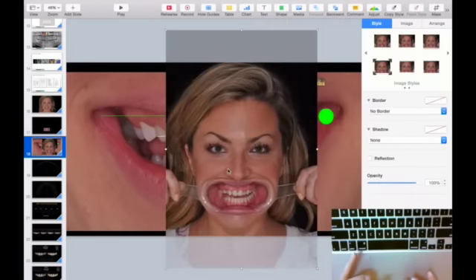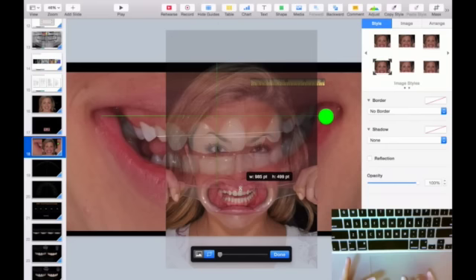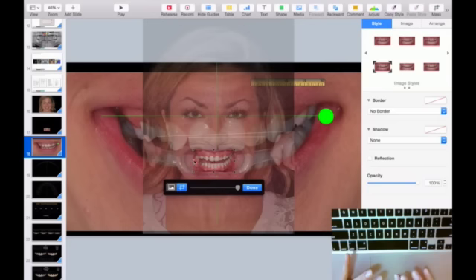Now I only need the mouth, considering I already took all the lines, the facial lines, to do my DSD, so I don't need all of them. So I'm going to paste it the same way I did the other one, double click and bring in the lines. Let's take a little more over here.